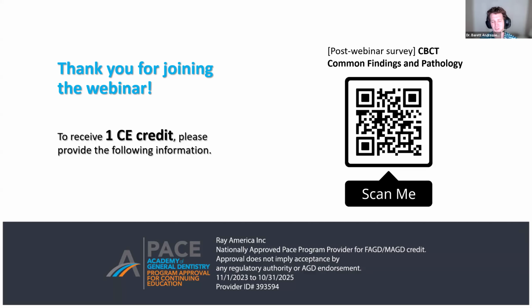So generally, though, on a CBCT scan, you see radiographic evidence of a root fracture. So very focal, isolated patterns of bone loss along the root structure or along the root surfaces, but you won't actually see a frank radiolucent line going through that root.